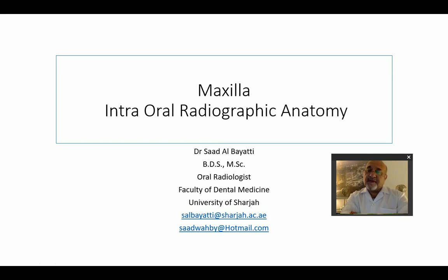And in this video, we're going to discuss one of the important subjects in the interpretation of radiographs, that in most cases is overlooked, and this is the anatomical landmarks that are seen in the intraoral radiographs.